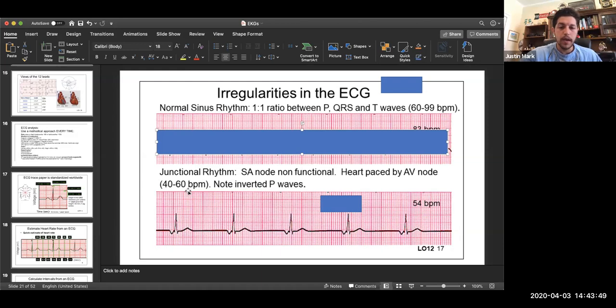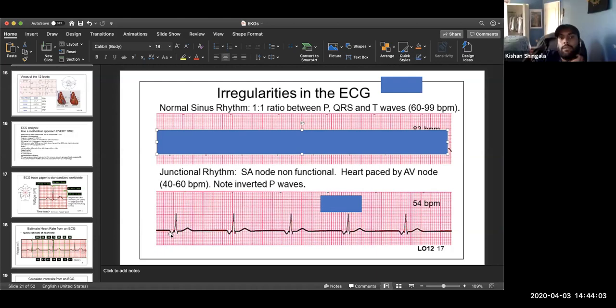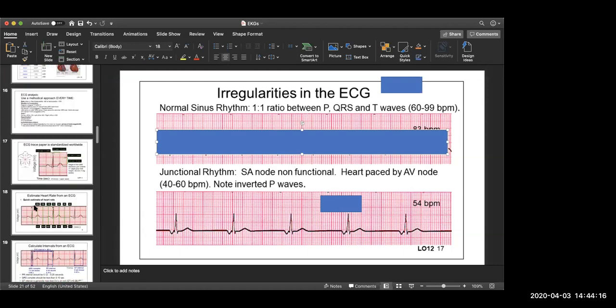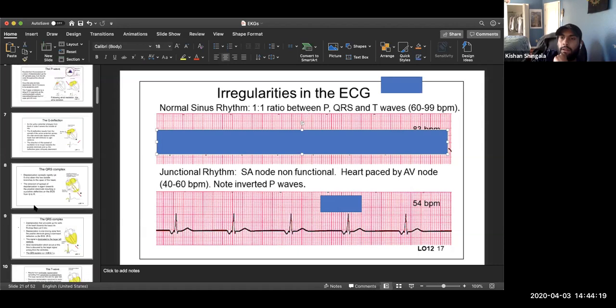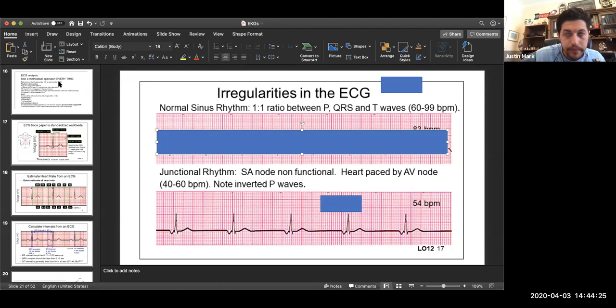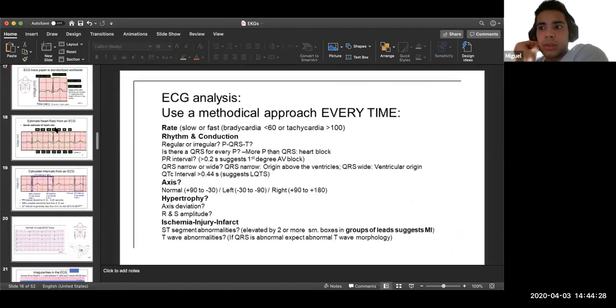And then also, what's going on here? I like that you guys are putting things together. If this is lead 2, the negative deflection of the P wave tells us that it's going backwards. So you're absolutely correct. P waves and the QRS complex should always be in the same direction, no matter where the lead is. Is that right? They're both depolarizing the same way, so they should always match up whether they're flipped or not. For normal sinus rhythm, it should be the case.